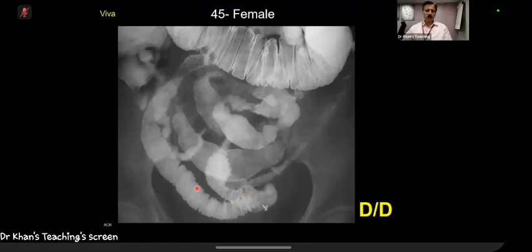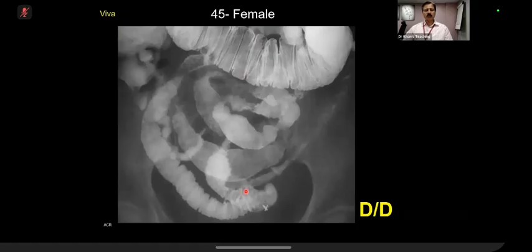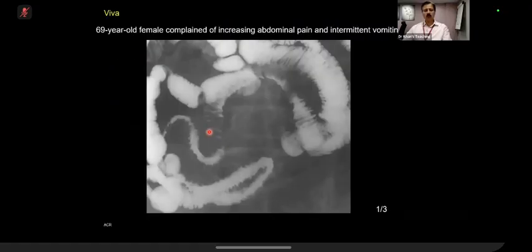Right. And what do you think about this loop here? Is there a bit of mucosal thickening? Yes, there is mucosal thickening there. Right. And what is happening here? Is there a bit of obstruction? Yeah, proximally the loops are dilated as well. Okay, so now this is a classical example where you can see chronic changes, you can see a bit of acute changes, and this all fits in radiation. So please remember that radiation changes just go on and on. So both things can go together. Okay.